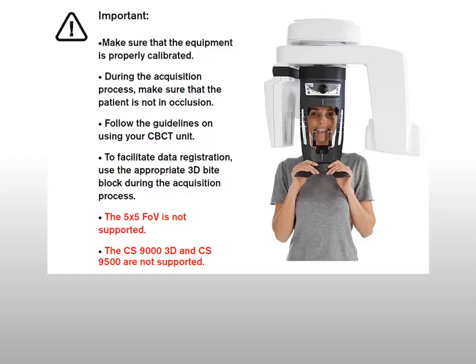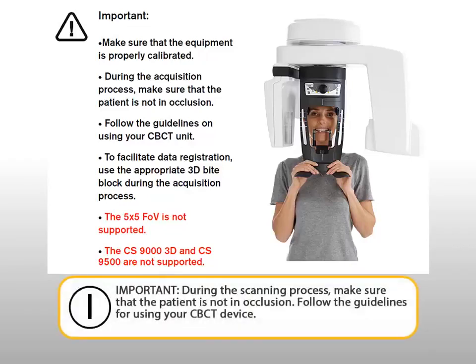Then perform an evaluation of the region of interest and take the necessary measurements. Important: during the scanning process, make sure that the patient is not in occlusion. Follow the guidelines for using your CBCT device.